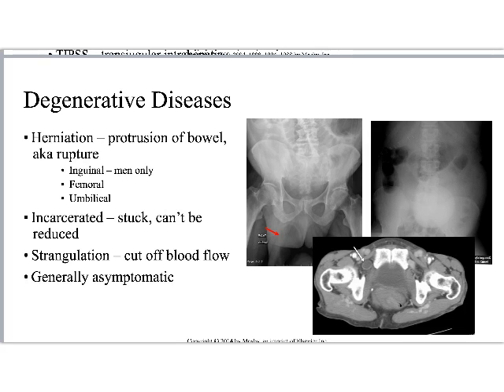Inguinal is for the guys only, right? It literally means a herniation into the area of the scrotum, if I remember correctly, right? That sounds very painful to me. And this picture here with the red arrow is indicating just that, right? So there's a giant air bubble in this person's scrotum, right?